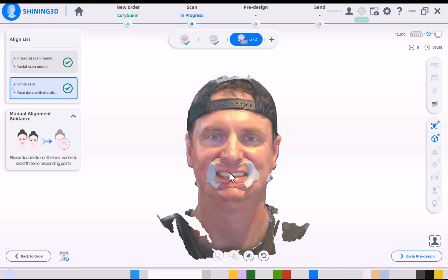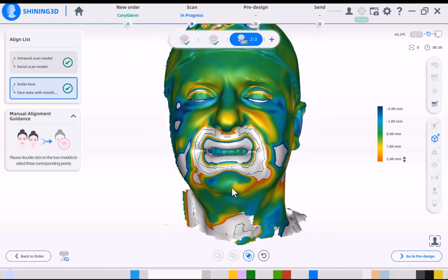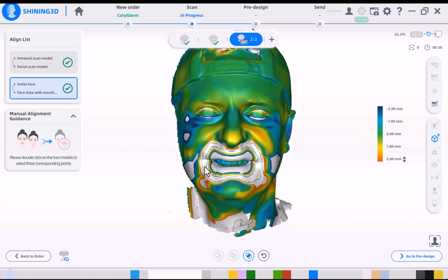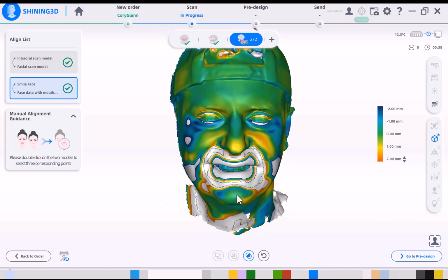Well, think about what changes between these. My forehead, nose, all of that should be relatively constant. But once I insert retractors versus when I'm smiling, everything around the mouth and the jaws I would expect to change. So when I go to that same little heat map that shows the match, that's exactly what you see. Everything up here is virtually identical. It's all in the green. And then the facial muscles used in smiling or where my lips are retracted are going to be way off. So I can't rely on them.